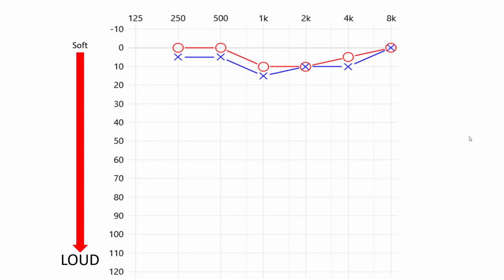In fact, it's common for most audiologists to stop testing at around 0 decibels, because relatively few people have hearing that's better than 0 dB. And also, in many conditions, even in sound-treated rooms, it's hard to hear those softer sounds.